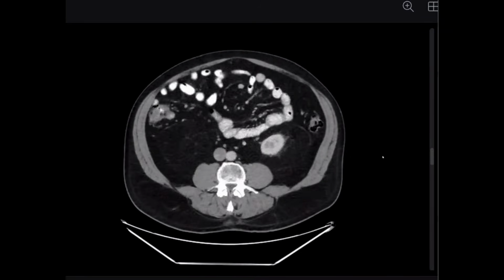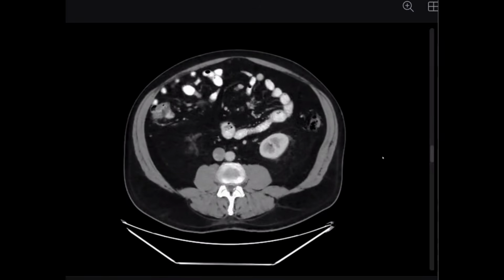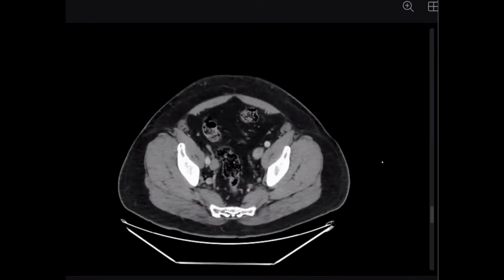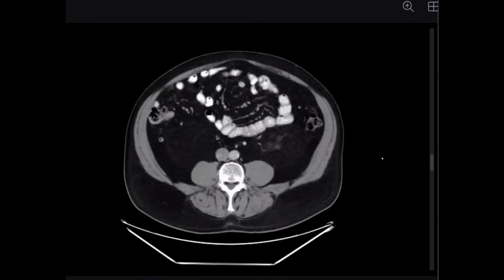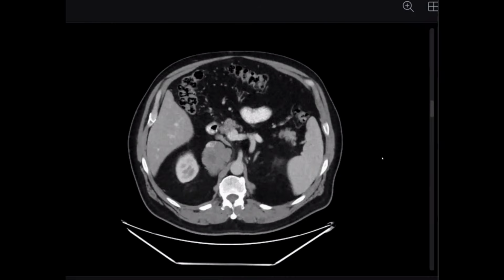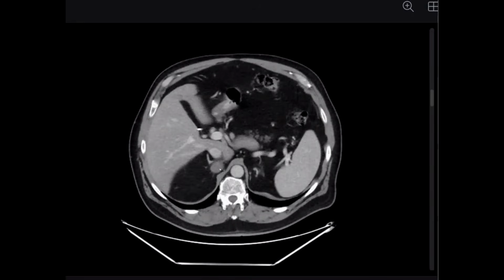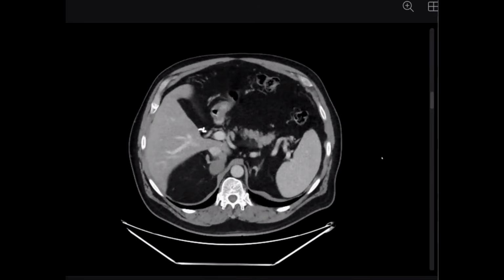One simple cyst is seen in the right kidney. Can you please raise your voice? So we have a retroperitoneal mass, as you said, showing heterogeneous enhancement and a necrotic core, and this mass is invading the IVC, the infrahepatic portion of the IVC. Do you agree? Yes, sir. And I think it's abutting the right diaphragmatic crus, as you can see here. So what's your differential diagnosis in this case?